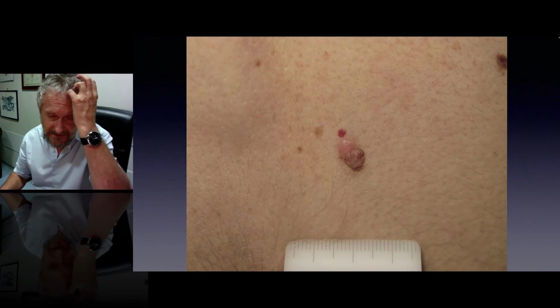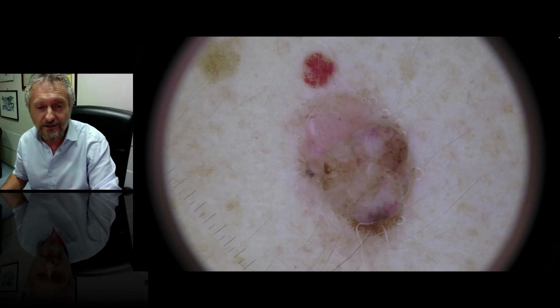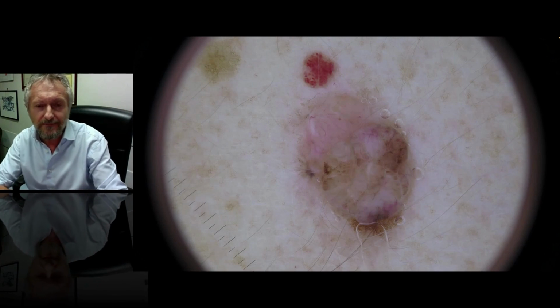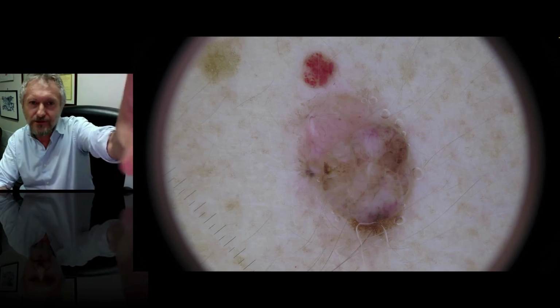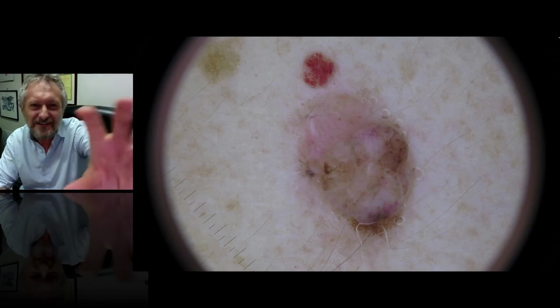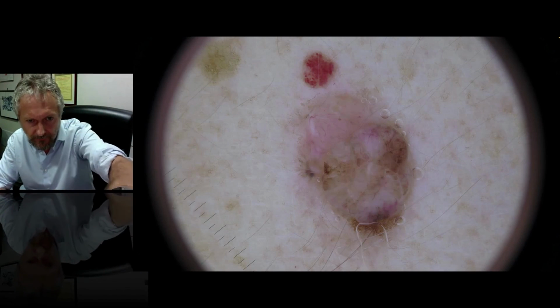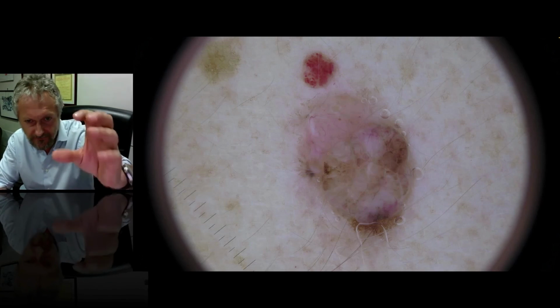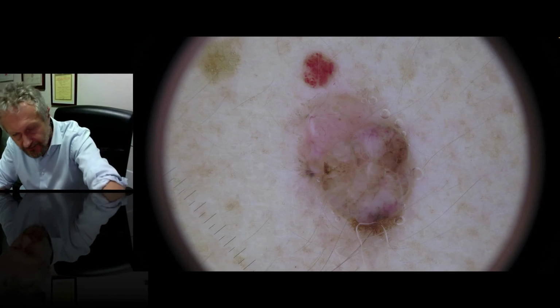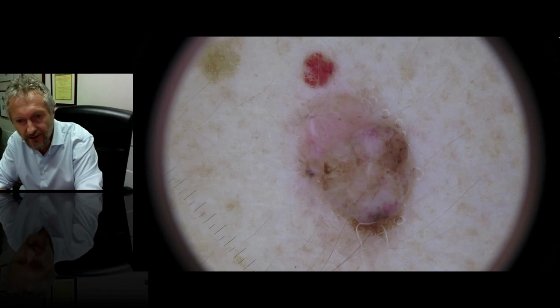And in my view, this is the most funny looking collision lesion. Well, actually, it's a combination of 3 lesions. A hemangioma on top, which is a little bit disconnected from the rest of the lesion, which is composed on top of beautiful arborizing and sharp in focus vessels, so BCC, but at the bottom side of the lesion we see remnants of a dermal nevus, a compound, predominantly dermal nevus.